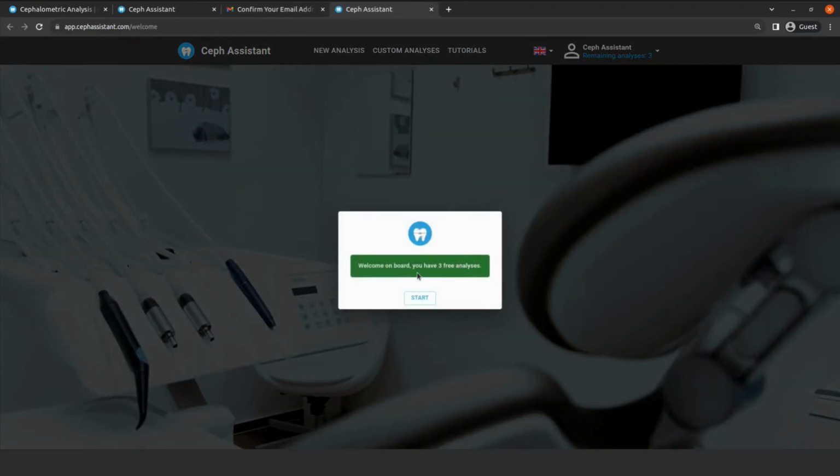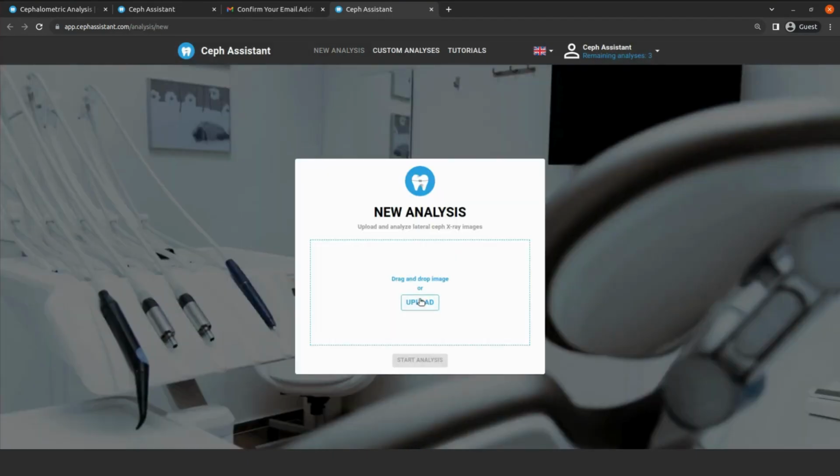Welcome on board. Now you can make 3 free analyses with Ceph Assistant.